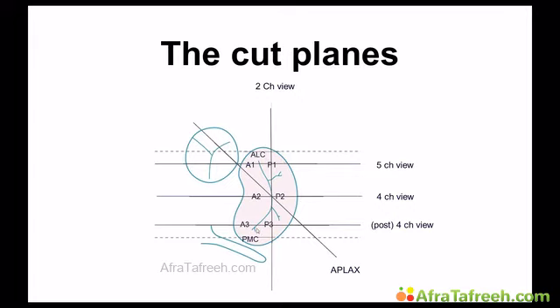And the posteromedial commissure is to the left of the image, and the anterolateral commissure is to the right. And then adjacent or close to the anterolateral commissure, we have the section of A1P1. This is the Carpentier classification, which I guess many of you are familiar with.